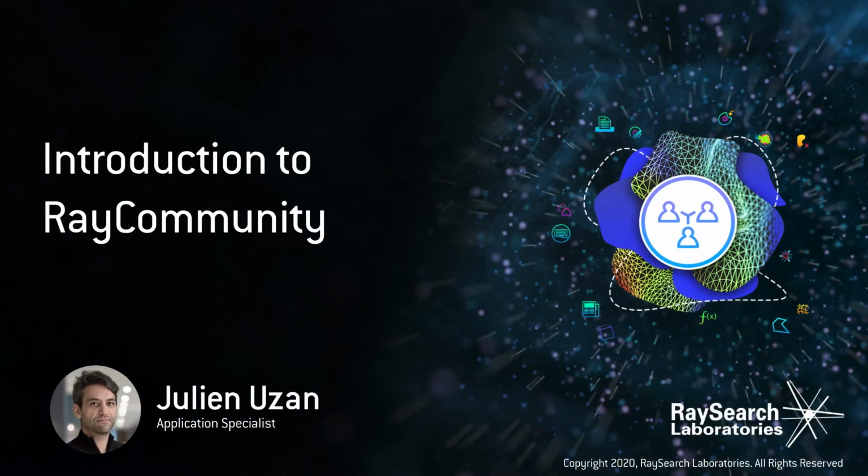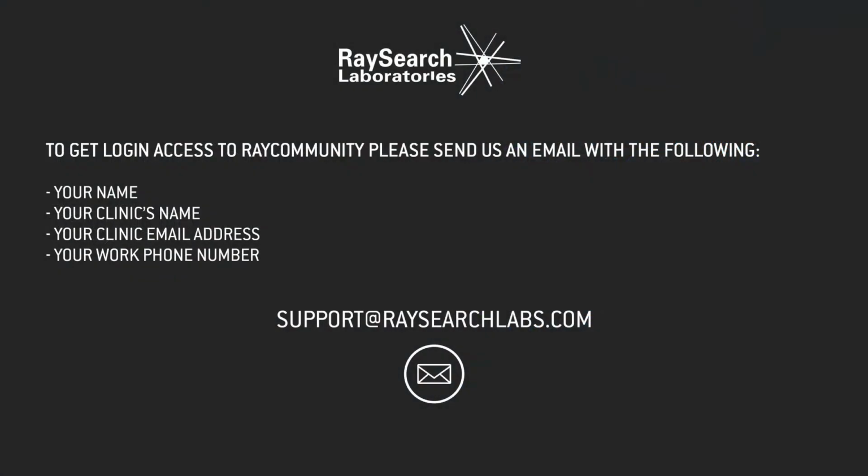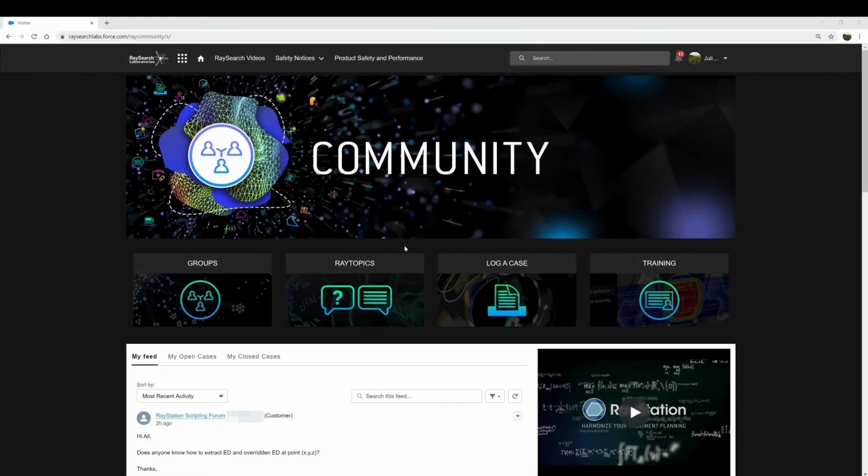If you use a RaySearch product like RayStation, RayPlan or RayCare, we really encourage you to also sign up for a RaySearch Community account. With a community account, you will have access to valuable online resources and support to help you get the most of your RaySearch products. All the activities and resources are available from your homepage.